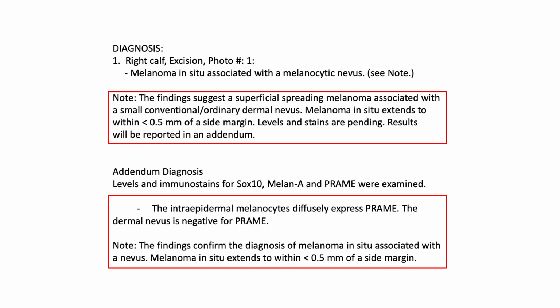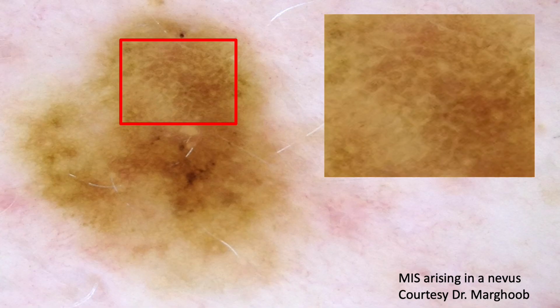One thing I want to point out, sometimes the brownish sausage-like globule structures, you can see little dotted vessels through them. And you don't see them in the whitish portion of the negative network. And indeed, this was melanoma arising in a nevus, and that seems to really hold up in my clinical practice. It does suggest melanoma arising in a nevus when you see negative network.